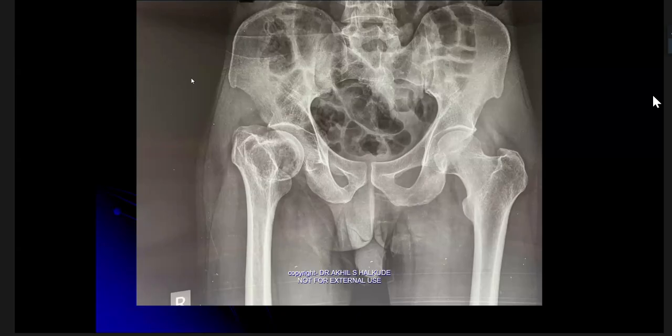Good evening, sir. Yeah, please continue with the description. Sir, I have been provided with a radiograph of the pelvis.